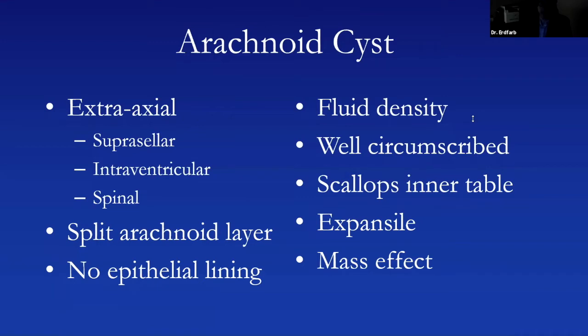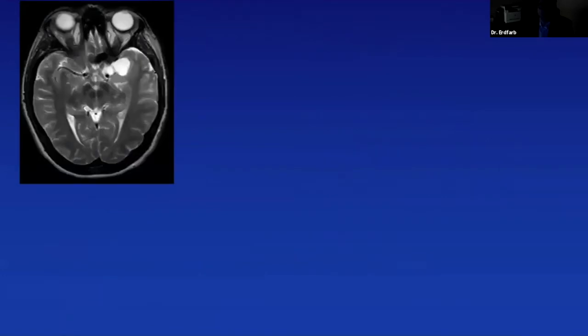So that's the first one. Arachnoid cysts, 1% of intracranial masses. You'll see them all the time. Don't-worry lesions. Now here's another lesion, on MRI, and you see T2 brightness or T2 intensity in the fissure right over here, left MCA.